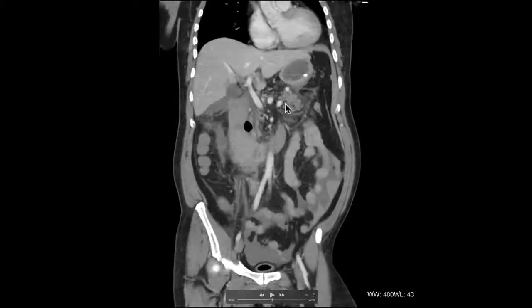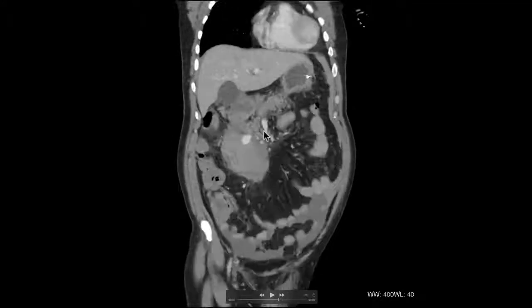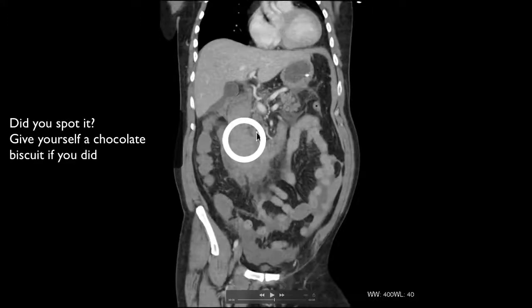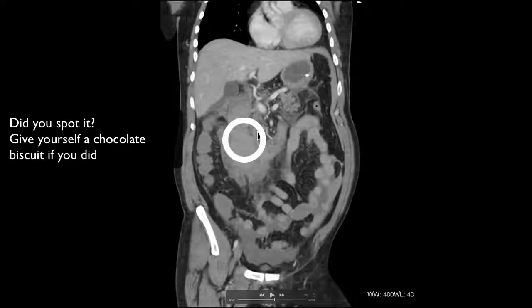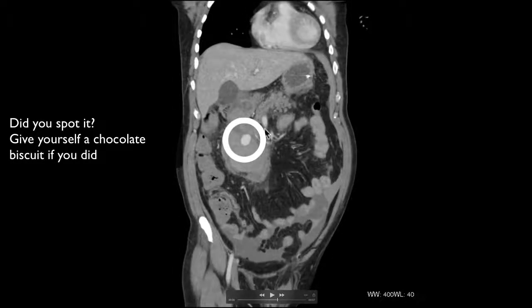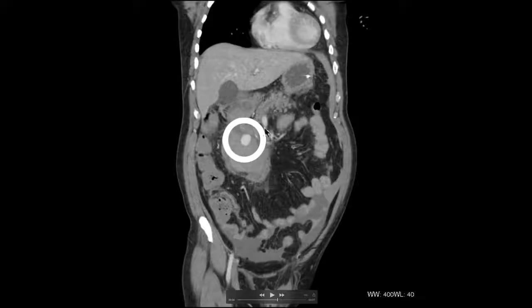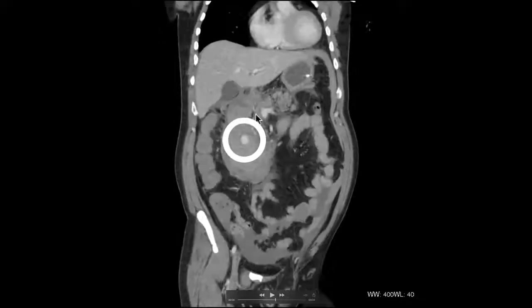This patient's got another vascular complication though that you sometimes see with pancreatitis, and that's a pseudoaneurysm. A pseudoaneurysm is basically when you have a defect in the wall of an artery and you have a contained leak effectively. That happens in pancreatitis because you get all the nasty pancreatic enzymes released, and they sort of bathe the vessels, and there are lots of blood vessels around the pancreas. There's a rich blood supply coming from the SMA and the celiac axis.